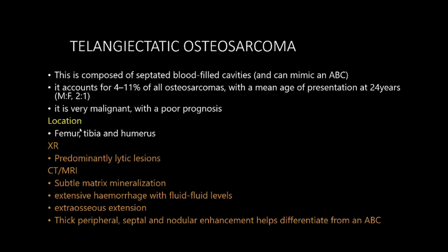It is very important to differentiate between the benign fluid level and the malignant fluid level. Many authors say that if you look at the tumor in the MRI sagittal sequence and find that more than 70% of the tumor is presenting with fluid levels, it is more likely to be a benign tumor.